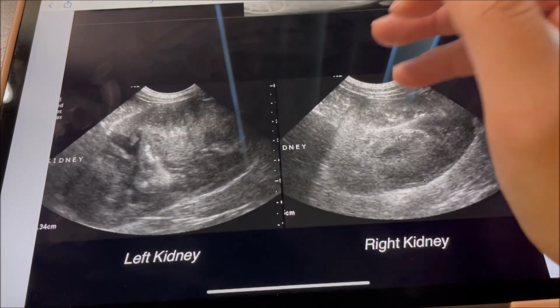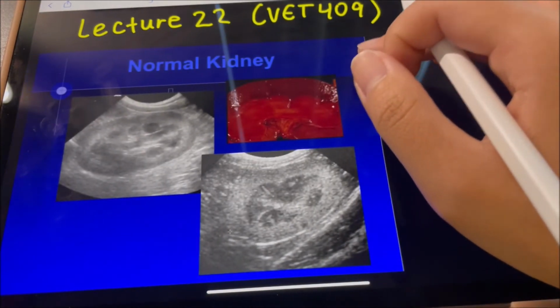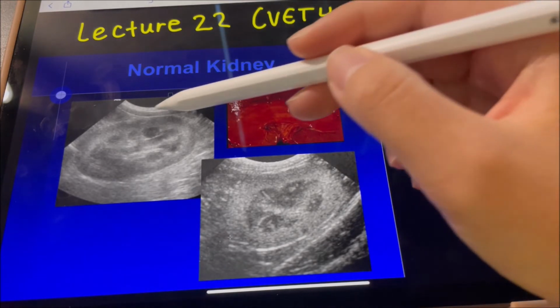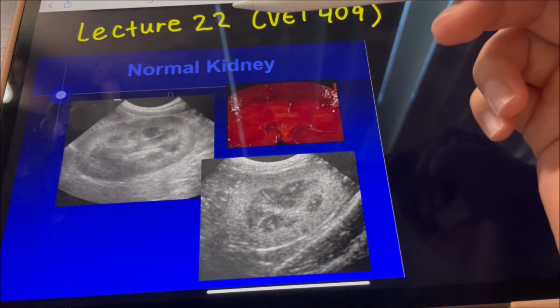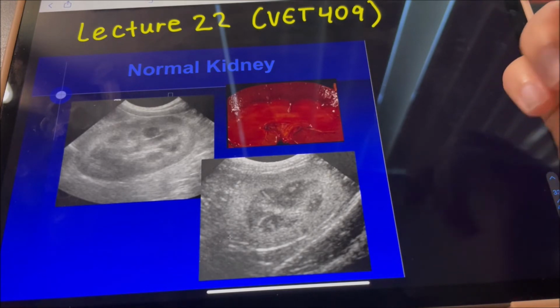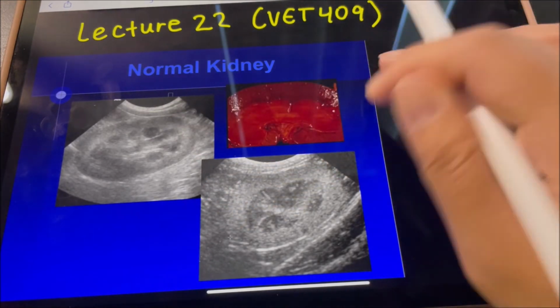Before we look at this patient's ultrasound, what does a normal kidney look like? Going back to renal block, we learned that normal kidneys should have a renal cortex with medium echogenicity, a medulla that is hypoechoic and mixed echotexture, and a renal pelvis / hilus that is echogenic due to fat. And it looks like a tomato.